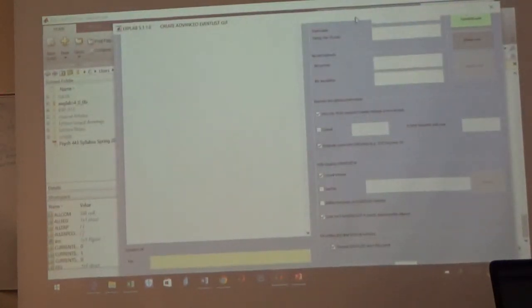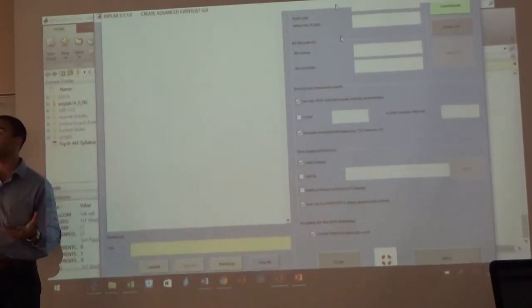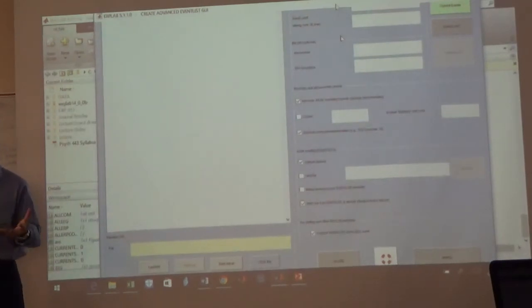When you hit Advanced, this is a way to create a more detailed list of the events. Now remember, we have 75 of these SARs, right? And none of you guys said you wanted to write a list of the 75 things, right? Everybody seemed pretty happy that I did it for you.